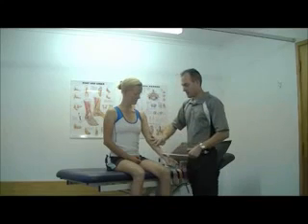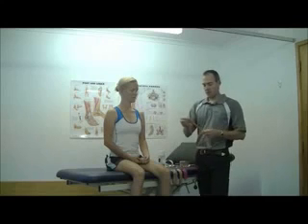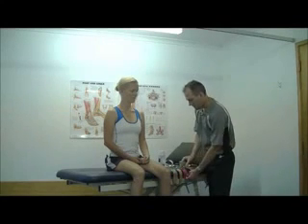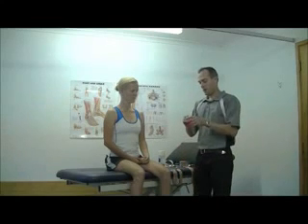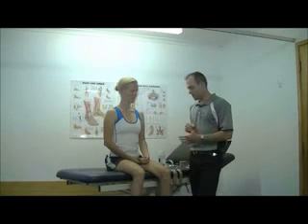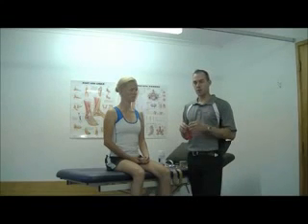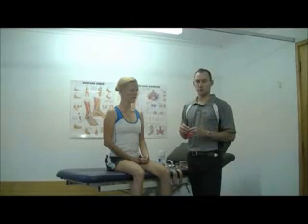Because there is some elasticity in the tape, and in this case a high degree of elasticity, it often raises questions regarding the similarity with kinesio tape. Now, as I pointed out, the kinesio has a very rigid endpoint. The two tapes have been designed with very different aims in mind. The dynamic tape has been designed to be a very strongly mechanical tape. Its aim is to assist particular muscles or to use the elasticity to do some of the work so that those muscles don't have to do so much.